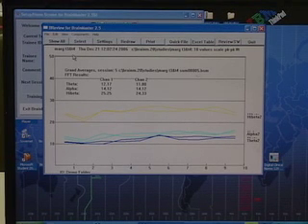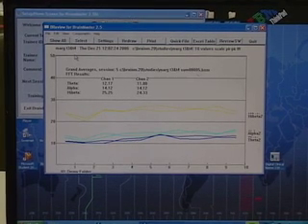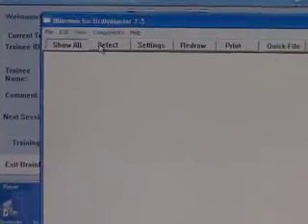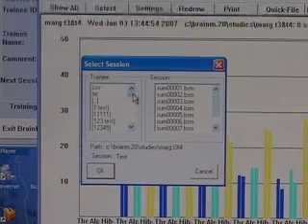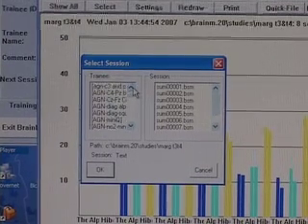Now, what about my software? Where can you find my software? Well, what I'll do is go back to a mini-Q assessment. So I'll just click Select. And I will click one of the mini-Q assessments that I have done on my machine.